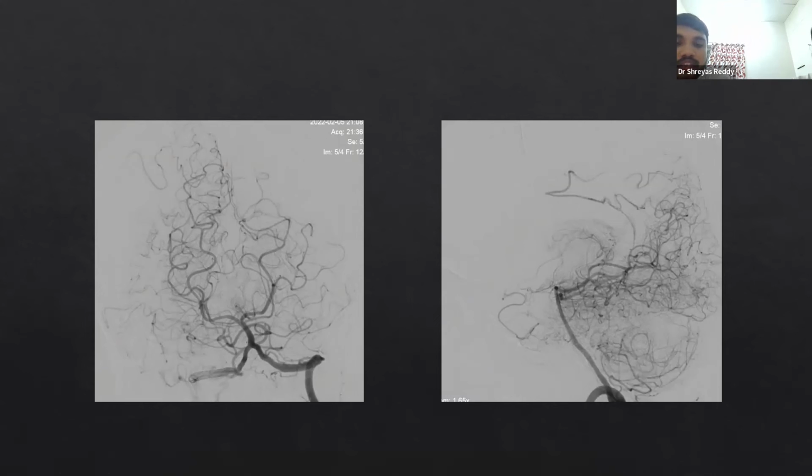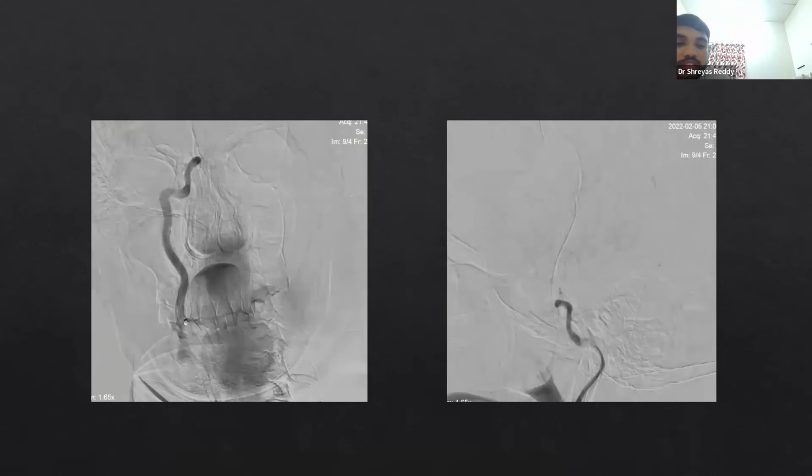Can you go to the next image? Now you are seeing a faint signal at the top, right? Yes. That is the same thing you are seeing in the angiogram, and it stops exactly at this level, the cavernous level. Why do you think this has happened? Because there is thrombosis distally. No, there is an occlusion. There's a tight stenosis there, or an ICAD sitting there, or atherosclerotic disease which is causing occlusion, and there is passive collapse of the ICA.